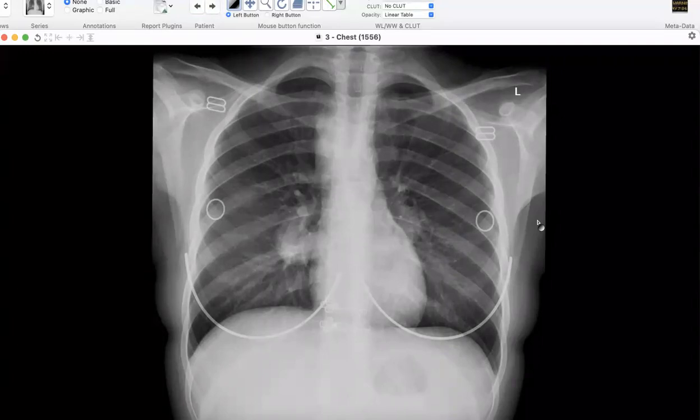And fine. So you said this was a hilar mass, right? Yes. And you said there is some paratracheal soft tissue. Yeah. All right. So just give me your differential for hilar masses first. So this is right-sided. Generally speaking, right-sided hilar masses. What would you think?